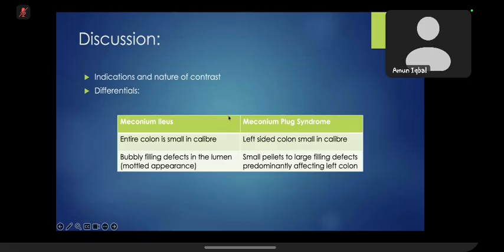Okay. So this is particularly important when you approach such a case, when you are going to conclude in your report that the baby passed the meconium on the table, because that will tell the primary physician that the baby did get a therapeutic management as well.